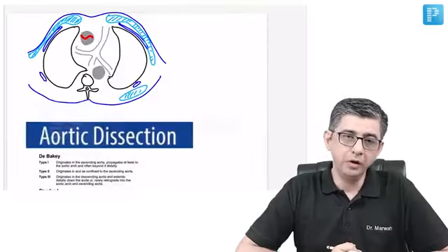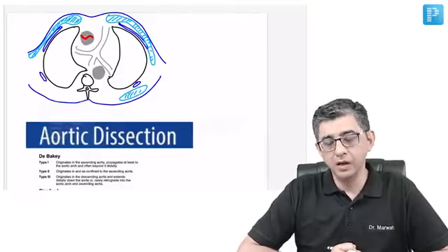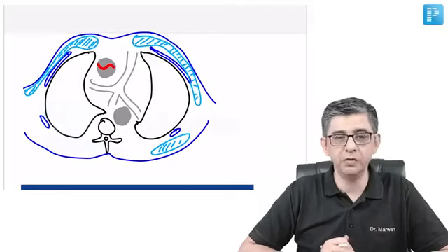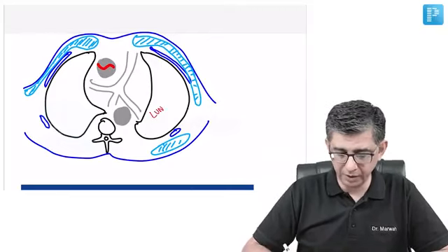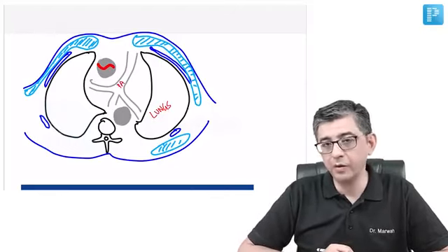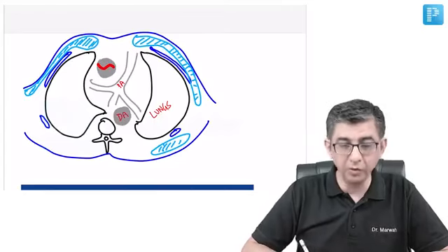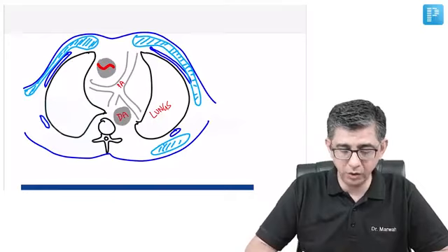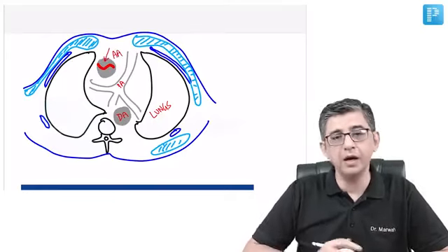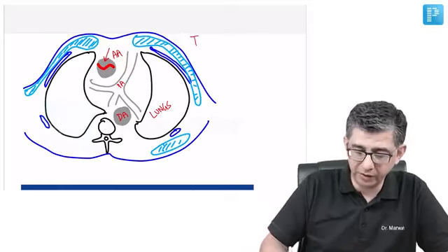Now coming to the subsequent topic, which is a disease of the aorta, aortic dissection has been asked. I'll just zoom into the image which I've hand drawn before you, and there was a CT chest of the individual given. You can pick up the lung architecture here. The blood vessel which is present, and I marked at the moment, is the pulmonary artery, and then it's bifurcating into the two. Posteriorly, you can see the descending aorta, and anteriorly you can notice an intimal flap in the ascending aorta of the patient. And well, this tells you that this patient would be having a type A aortic dissection.